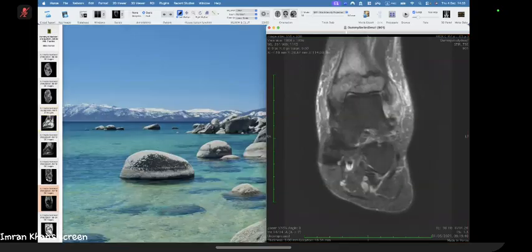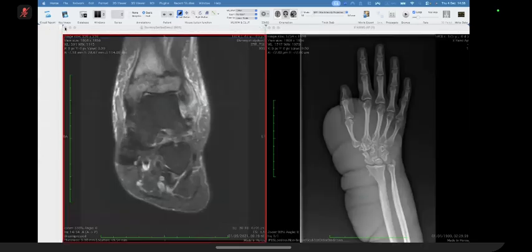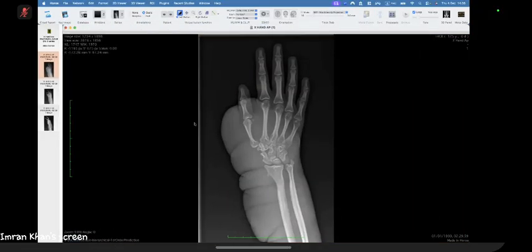The second case actually is, I kind of showed you Aunt Minnie's. So, all right. Yes. So this is... what is the diagnosis? I'm going to look at the chat. Has somebody put the diagnosis there? What's the diagnosis for this case?